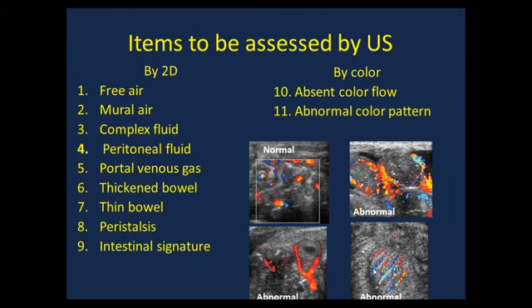And then we have 3 other abnormal color patterns. Can be like circles, that's a sign of hyperemia, or Y-shaped, that's also another sign of hyperemia, or zebra arrangement of color. 3 of them for sure are very different from the normal looking color pattern. The most severe form of color Doppler is if there is no color Doppler at all, which is a sign of severe ischemia.